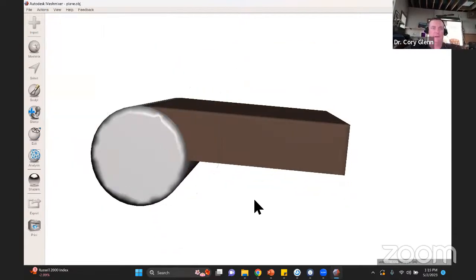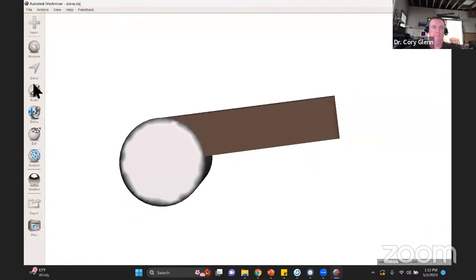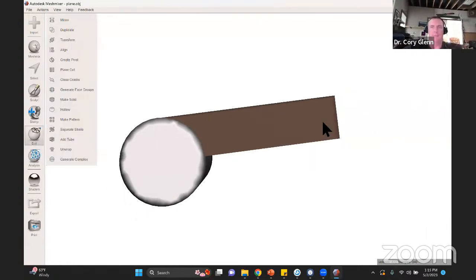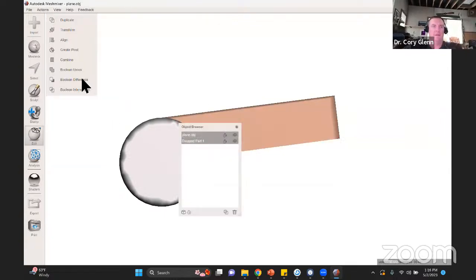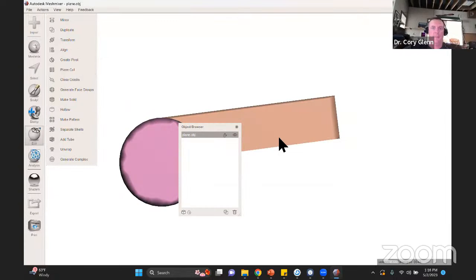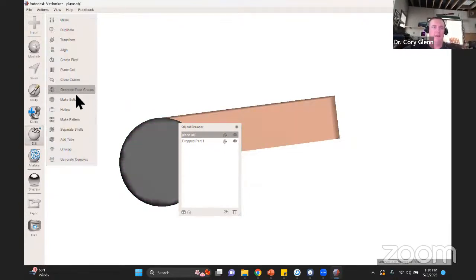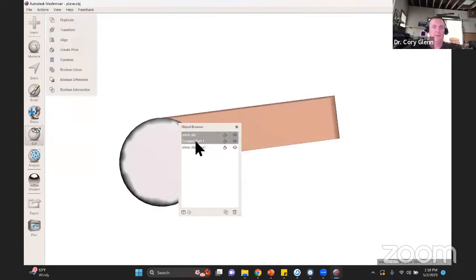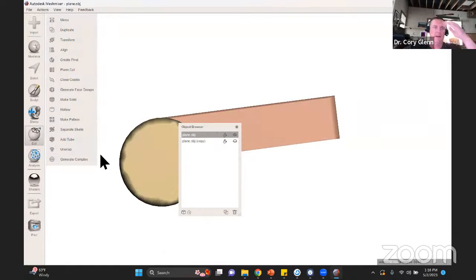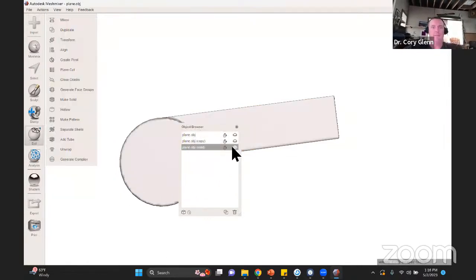Okay. So essentially I could do that and combine these two and make them solid. So let's do that. Combine. Actually, let's don't combine. Before I do that, I'll duplicate one of them. So that and that we combine, we could make solid, accept that.